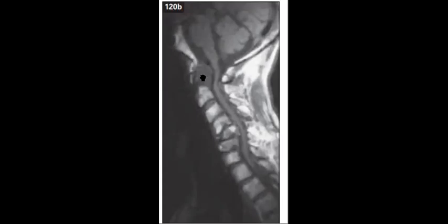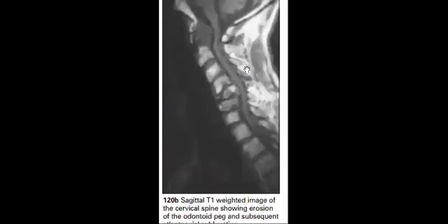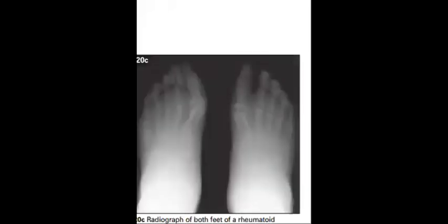Yeah, so he has this appearance that you know this patient has erosion. Perfect, Shayma, Huda. Nice, Marwa. I see many very nice answers. And if you go to the same patient's feet, then you can find that already he has a lot of signs of rheumatoid arthritis. Okay.